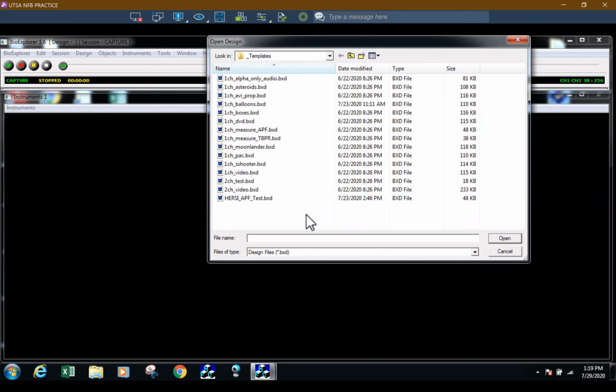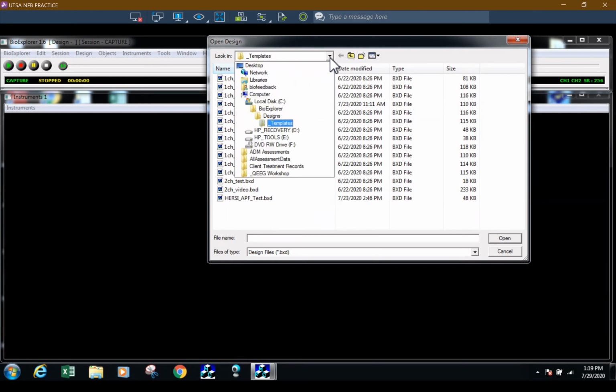So that must have been the last place where a file was saved to. So let's say we are looking for a client session to which we've already saved our design.